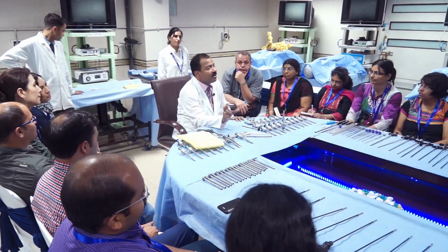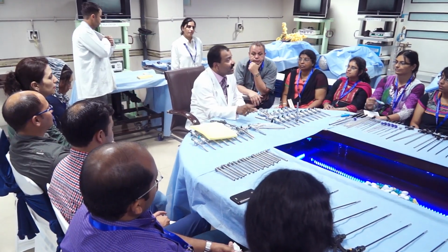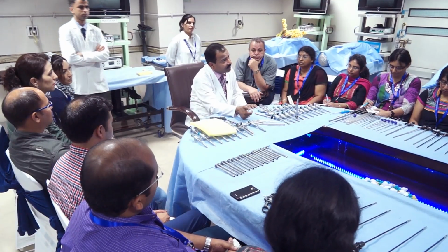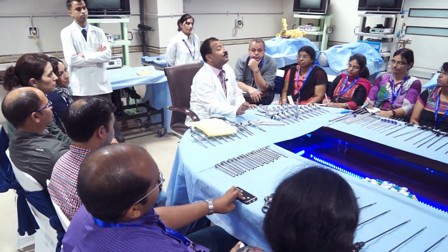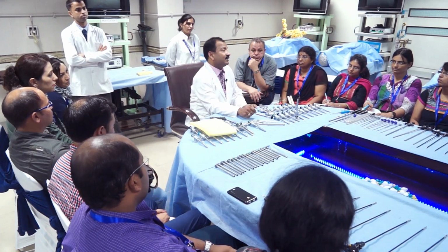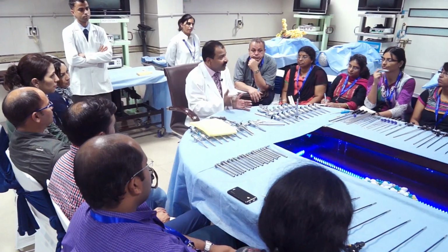These 26 letters are making millions of words due to the sequence in which they were programmed, and this you have to learn in laparoscopy. Just like you said, in cholecystectomy you have problems because your executional steps are fewer, it is not 51. You have to fill up the blanks where you are.